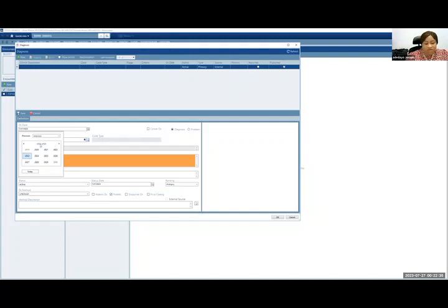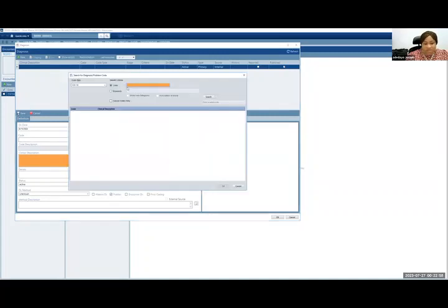So if you click on here, it will pull out and group the date into larger dates. So we've come to 2020 to 2029. I'll select 2022, choose a month, and pick a date. So that is the date on this woman's fictional biopsy report. The next thing is the code. So every cancer has a code. You can search with the code or you can search with a keyword.